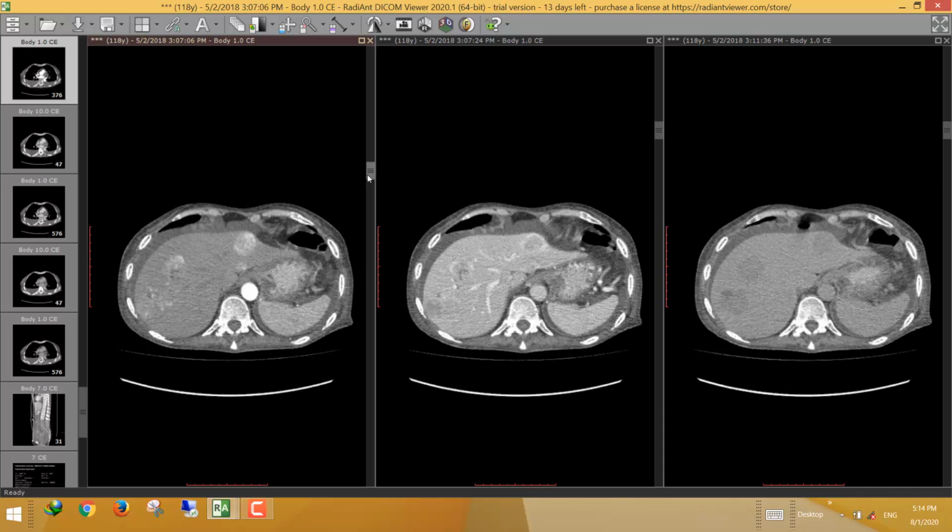And as we know, the hypervascular metastases have a limited primary, as most of the hepatic deposits are usually hypovascular, but a small number of metastatic processes to the liver are hypervascular. The limited primary origins for such hypervascular lesions are either renal cell carcinoma, pancreatic neuroendocrine tumor, carcinoid from the bowel, uterine choriocarcinoma, and from the thyroid, thyroid carcinoma.